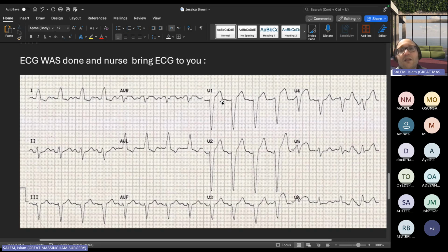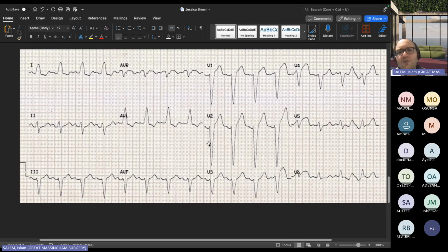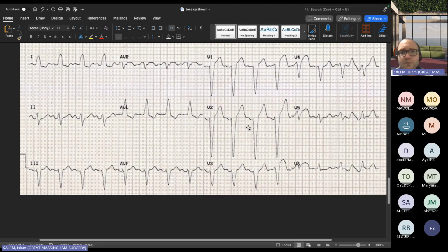There is a proportion between the depression and the elevation, and this is the Smith modification, and I will explain that. Again, V2, depression, elevation; V3, depression, elevation. And in the rest here, you can see the vector is elevation, and then the ST segment depression here you can just ignore, because that's normal in the left bundle branch block.